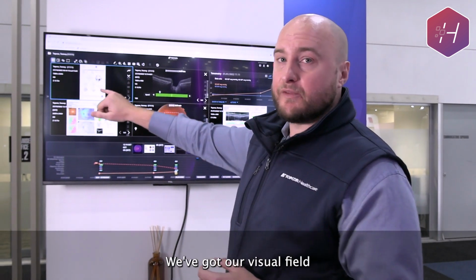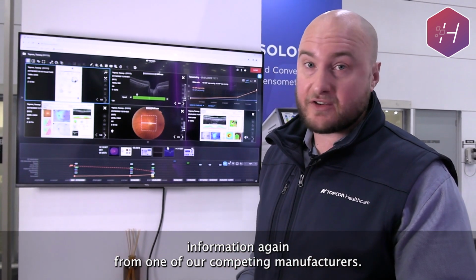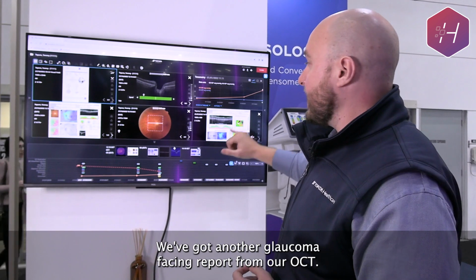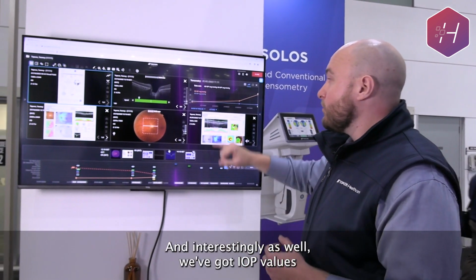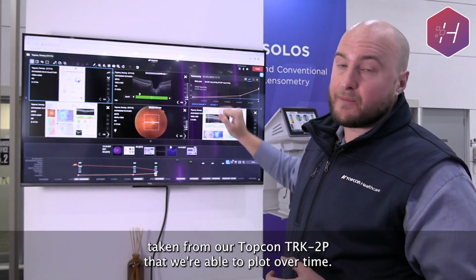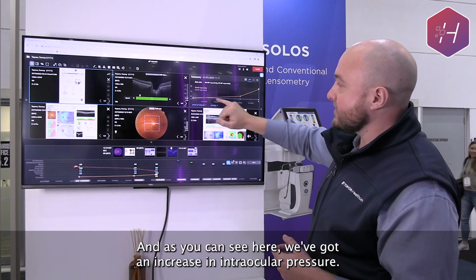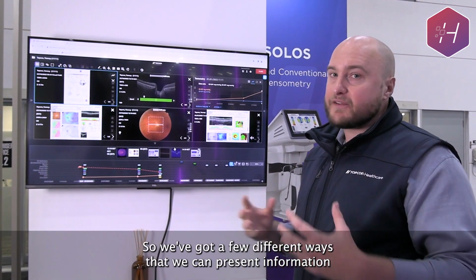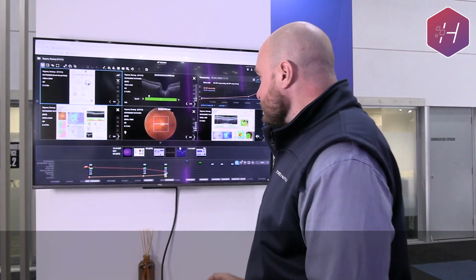Up the top left here, we've got our visual field information, again from one of our competing manufacturers, Zeiss. We've got our report from our OCT, and another glaucoma-focused report from our OCT. And interestingly as well, we've got IOP values taken from our Topcon TRK-2P that we're able to plot over time. As you can see here, we've got an increase in intraocular pressure. So we've got a few different ways that we can present information beyond just a static entry.